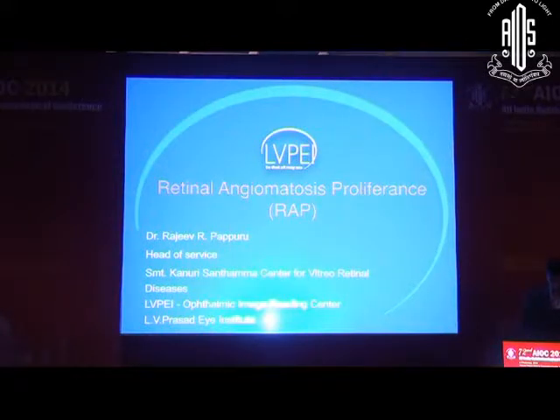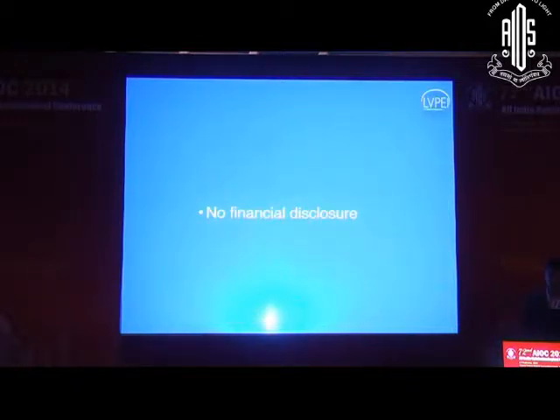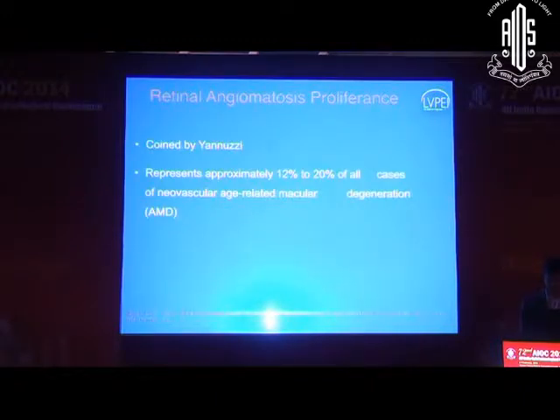So, continuing with CNVMs and vascular diseases of the macula, looking at retinal angiomatous proliferation.